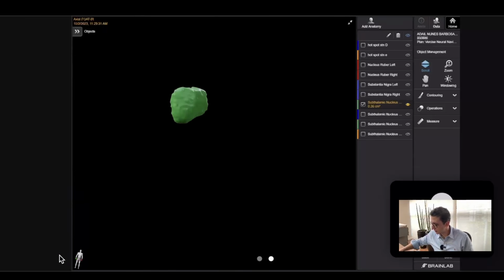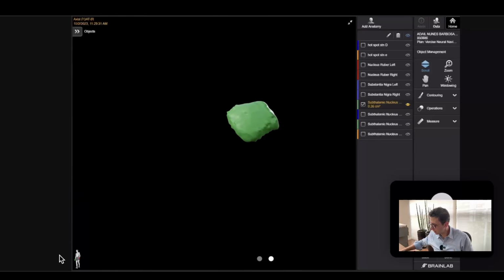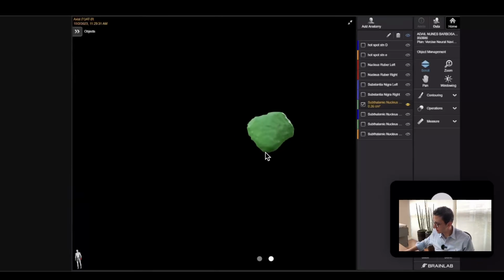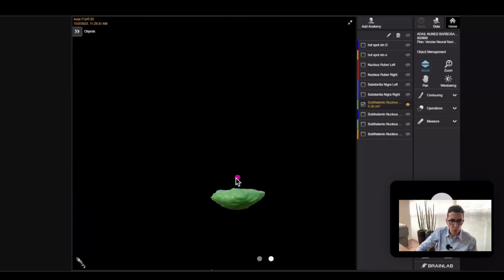So follow with me. It seems complicated, but it isn't. Look here. Look how this guy is looking toward the left, but I tilt the head a little bit. And once I do that, look behind the STN. It's flat. I want to see this flatness here.